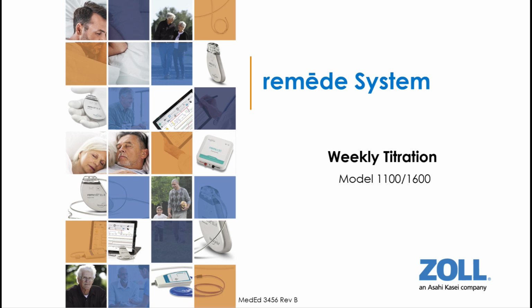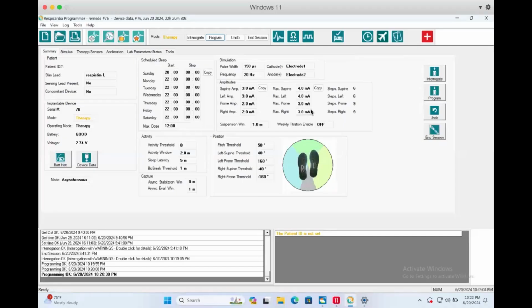How to configure weekly titration on Remedy models 1100 and 1600. How to configure weekly titration. The parameter can be accessed through the Acclimation tab on the programmer screen.